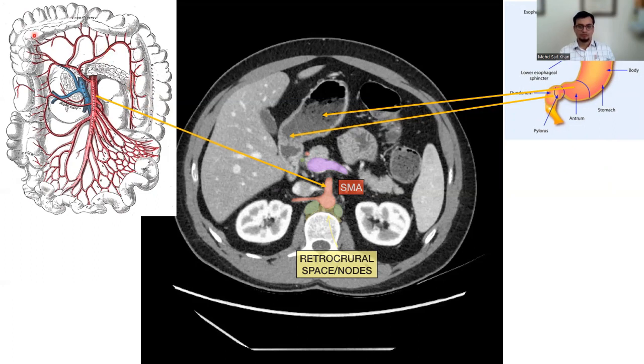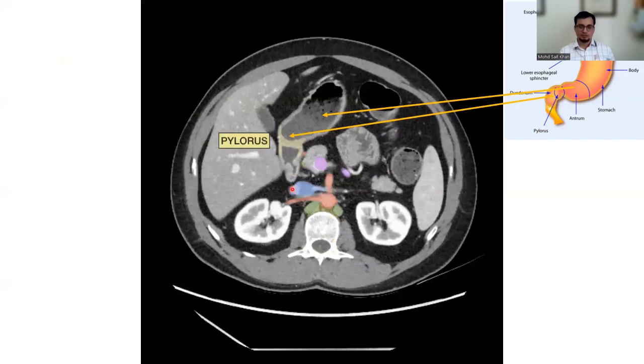through two-thirds of the transverse colon. Now here you can also observe the antrum, which is opening to the pylorus. So this is your pylorus, and you can see the pyloric wall. You can see it is opening into the duodenum.